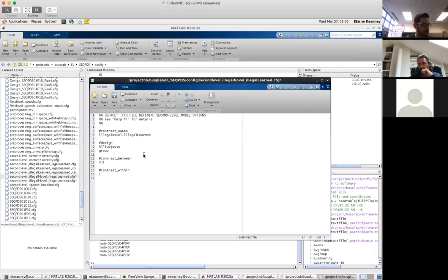I don't know if you want to look at what's the difference between stuttering and non-stuttering participants for the least stutter. I'm just saying not for this particular study, but in general, that's one thing that you might want to do with this type of covariates.